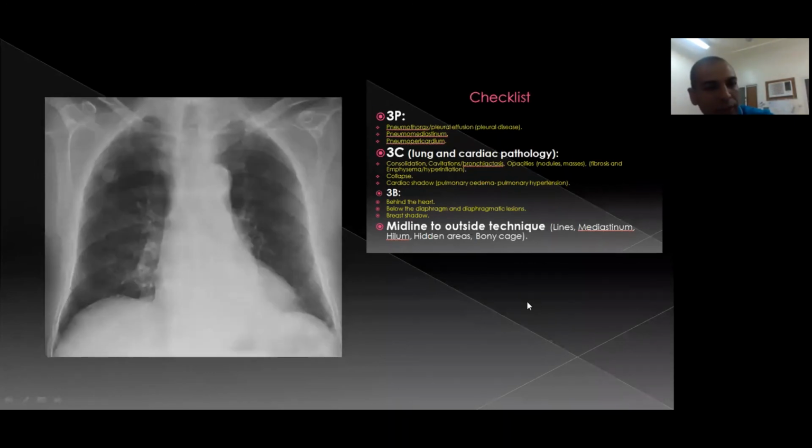Okay, let us shift to this one. It's very easy.